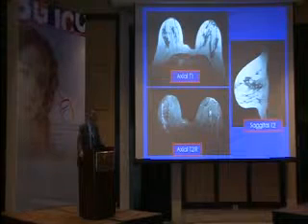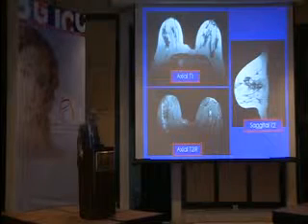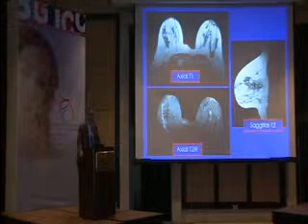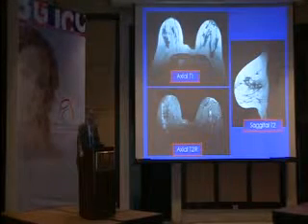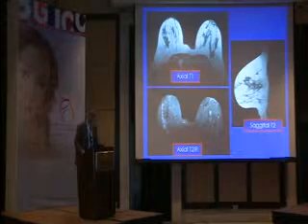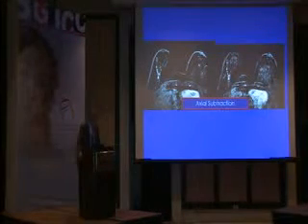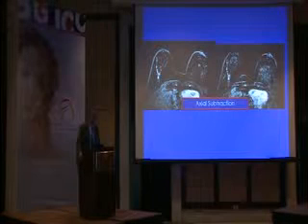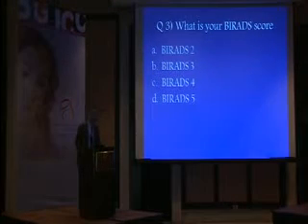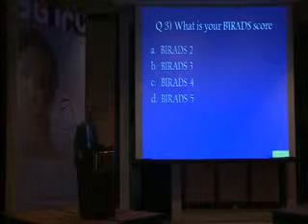And this is the MRI. As you can see, we have axial T1 and axial T2 inversion recovery and the sagittal T2 of the lesion. So, concentrate. Okay. This is the subtraction. So, what's your BIRADS? Is it 2, 3, 4, or 5? So start voting now.